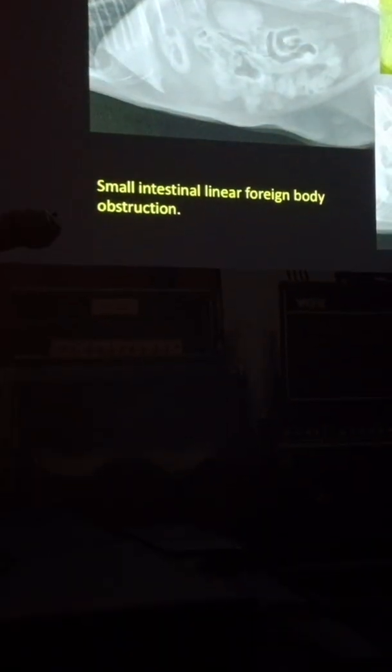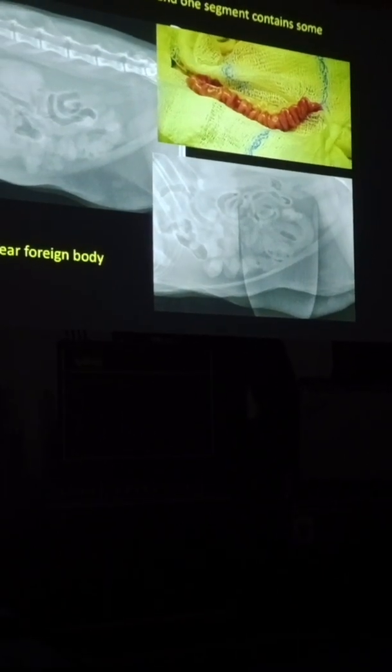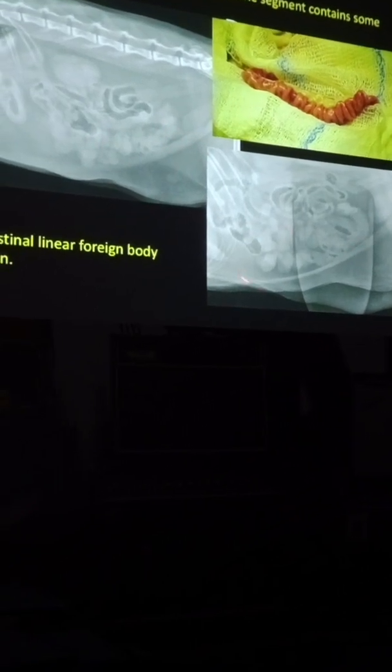And if you look at this intestine, you can see that it's plicated. It's going back and forth and back and forth. Look at this loop of bowel, how smooth the margin is. And then you look at this loop of bowel, see how smooth that is? Look how one margin is smooth, the other one. But look at how irregular the bowel is here because it's plicated. This is what it looked like at surgery. And it's this plication that gives this irregular appearance.